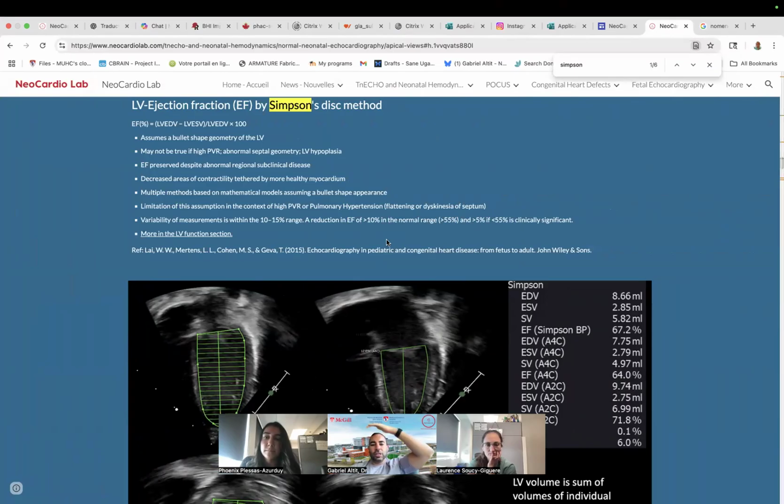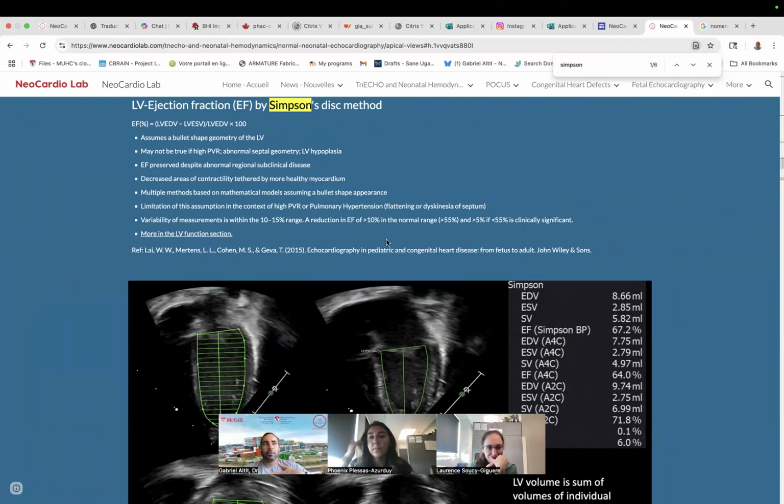In our methodology, and even when we describe it in our own papers, we've always used the short axis. One of the reasons is that, with a lot of the patients we see, we get a better aligned short axis in front of the mid papillary muscle, which provides a more accurate tracing of the endocardium. Versus in subcostal, we see a lot of preemies, so they have big bellies, they have a lot of air in their bellies because they're on CPAP or they're ventilated.